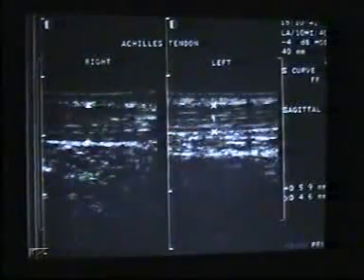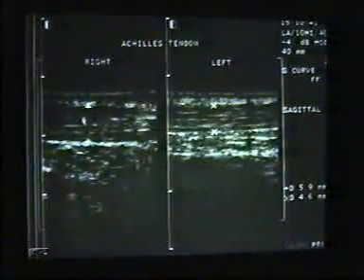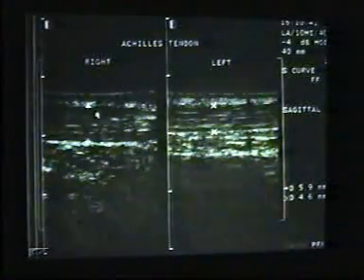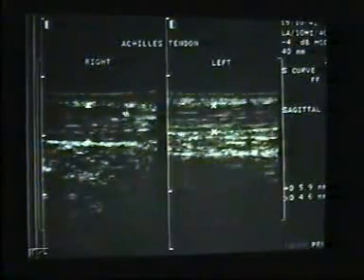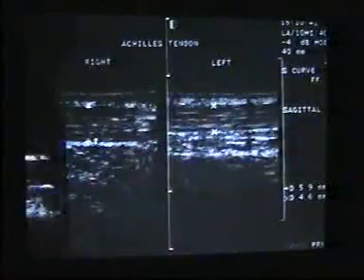Here we have a tendon which is normal. When we compared with the other side, this tendon had more area. It was more hypoechoic. There was some fluid around it, and it was acute tendinitis. In chronic tendonitis, we can get calcifications, but in shoulder, as here we can see in bicipital groove, this is bicipital groove, and here is the transverse ligament at bicipital groove. This is biceps tendon, and here is some fluid.